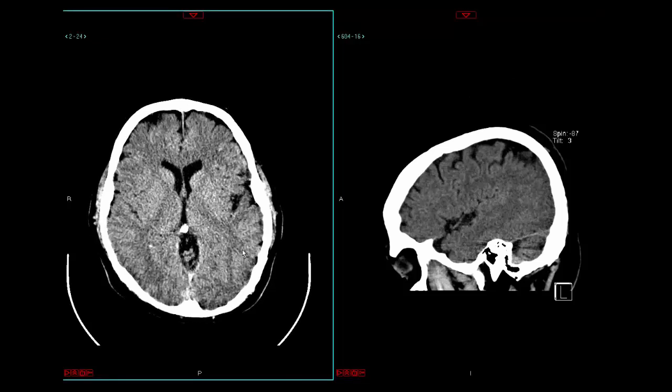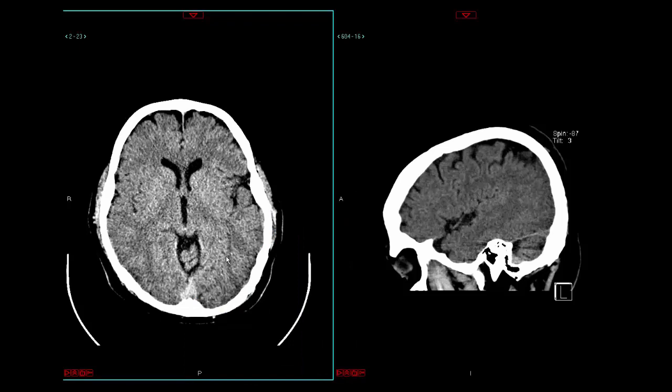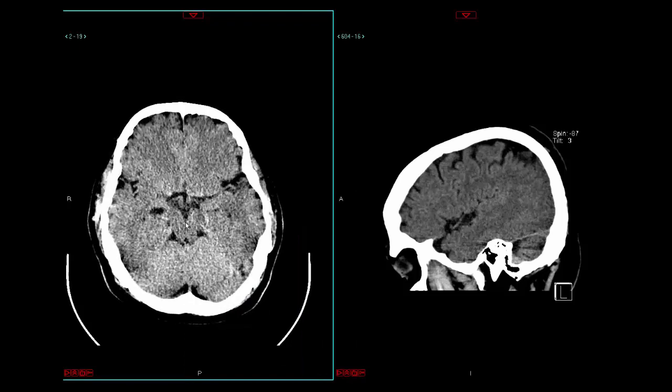We talked about being at the level of the thalamus to appreciate the superior temporal gyrus. As we go a little bit more inferiorly, we're going to get to the level of the midbrain here, and I'm going to just draw out the midbrain for you there. There's that left cerebral peduncle, the right cerebral peduncle. We come around to the colliculi there, and that'll be another session that we get into. But when we're at the level of the midbrain, we want to understand that we're probably at the middle temporal gyrus level here. Certainly we're well into the inferior frontal lobe here anteriorly.